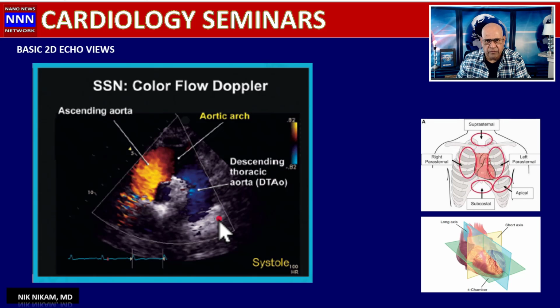So this is a crash course rundown on various echocardiographic windows and basic cardiac structures. I hope this introduction has been useful to you. When you are making rounds in the hospital, when your cardiology fellow or an attending is showing something, at least you have seen something like that before on this presentation, so you will be able to relate them to the various structures and planes.